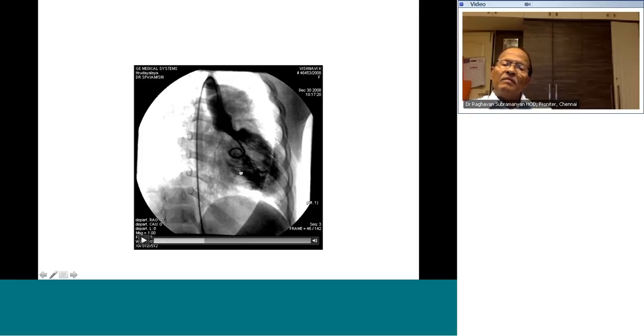You know, the ventricular septum is scooped out in the AV canal defect to produce a large endocardial cushion defect. This portion is scooped out, and that produces a gooseneck deformity. There is a disparity between the length of the ventricular septum in the inflow portion and the outflow portion. Okay, so it produces a gooseneck deformity, and this is the back of the goose, and this is the neck of the goose.